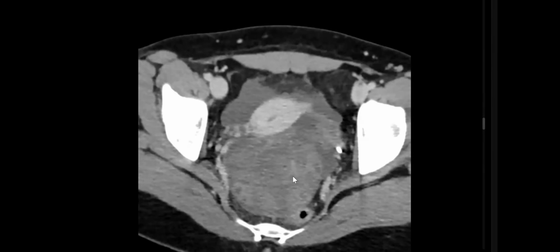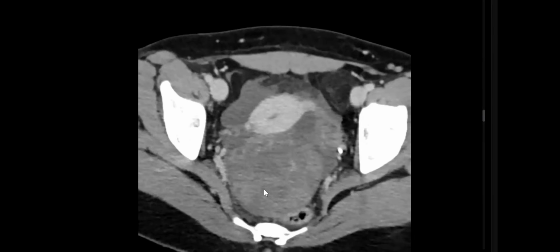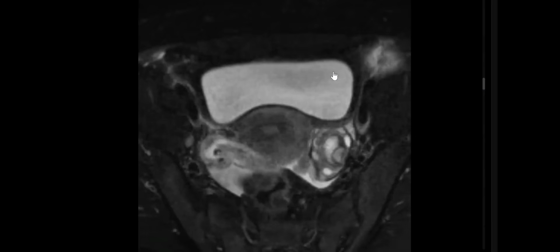And number two, abnormal location, posterior cul-de-sac. Abnormal location equals torsion. Reduced enhancement as compared to the left ovary. I should suspect ovarian torsion from CT with some reactive fluid. Okay, from MRI, of course, MRI will be much easier.